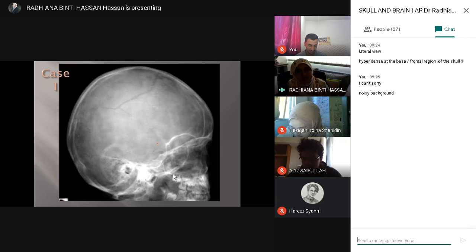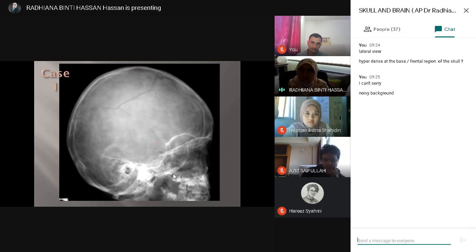If the marks allocated is 5 or 6, based on what was described just now, I don't think you will pass the film. So you will start asking, how come a film like this for findings can still have 5 or 6 marks, okay?